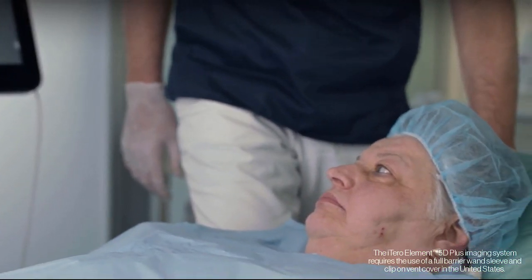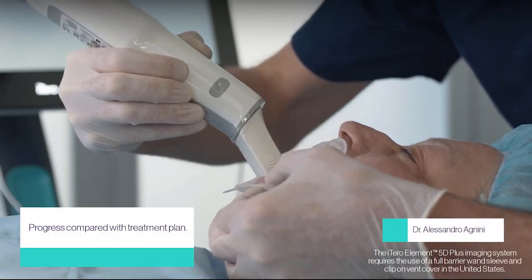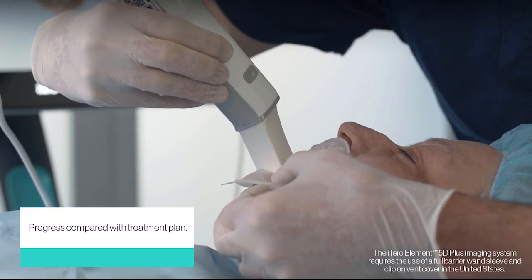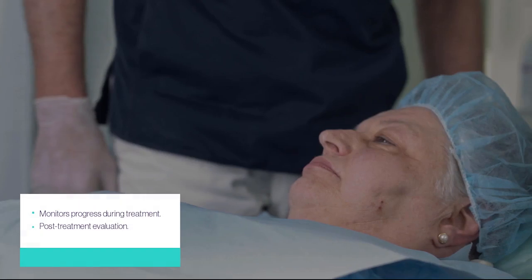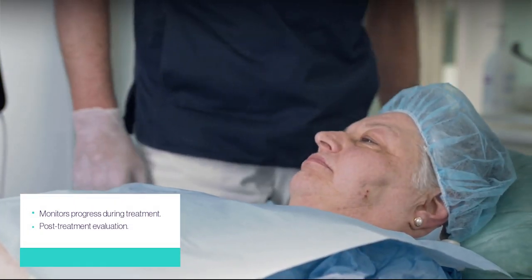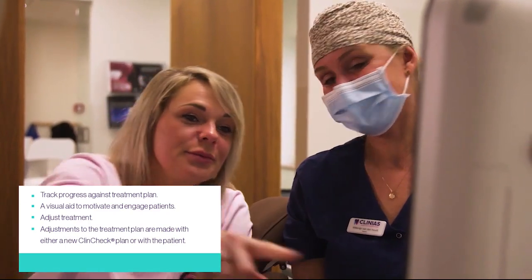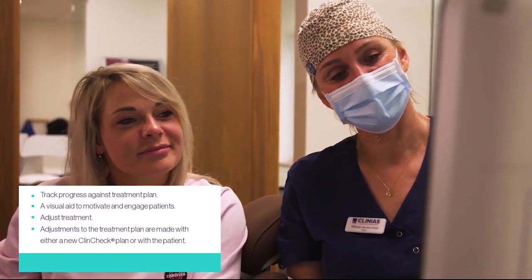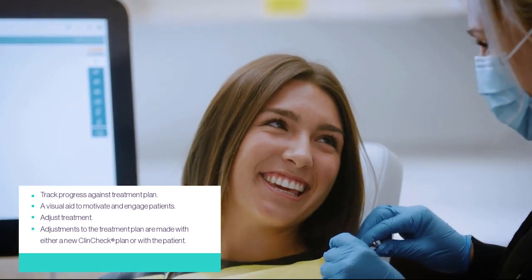The Invisalign Progress Assessment tool compares Invisalign patient progress with the ClinCheck treatment plan generated by the doctor using the ClinCheck software. Invisalign Progress Assessment tool can be used to monitor progress during all stages of treatment and also for post-treatment evaluation. This tool enables doctors to track the treatment against the ClinCheck treatment plan and make adjustments as required. It also serves as a visual aid to encourage patients and involve them in their own progress.